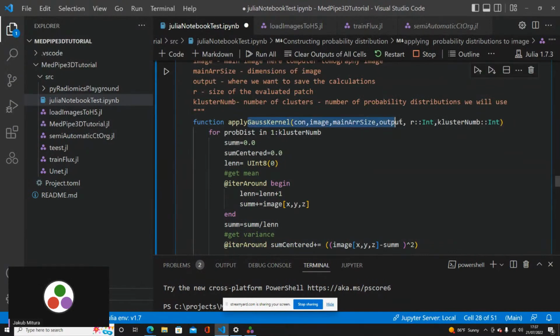And now what is happening here? Here we are defining the kernel. Yes, the kernel, for those that do not have any experience with GPU programming, is the program that is executed in the GPU. Yes, this is using the CUDA.jl. Absolutely fantastic package. Basically, without it, I wouldn't be able to perform any of it.